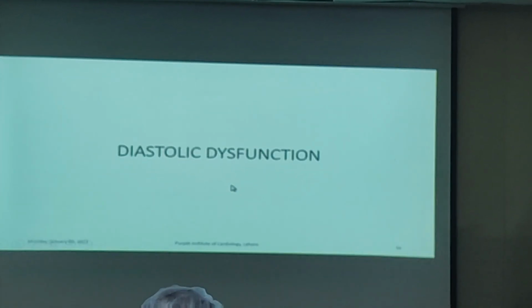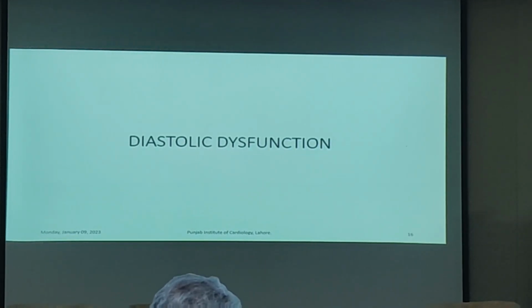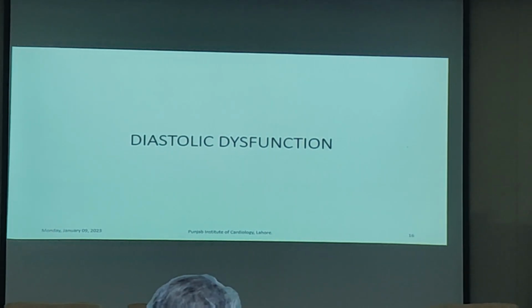Another important topic is diastolic dysfunction. It is very important for us to look at the diastole.